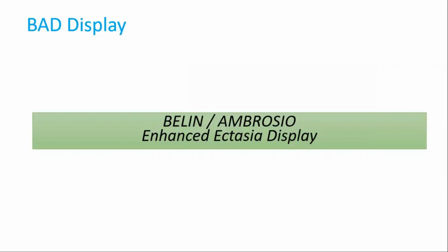So moving on to the BAD display, which is called the Belin Ambrosio Enhanced Ectasia Display.